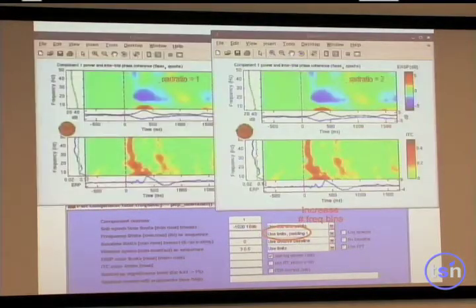You can use frequency padding. So this is the pad ratio of 1, pad ratio of 2, meaning that when it extracts this window, it's going to make them twice bigger. And you can see that it's smoother here than here.